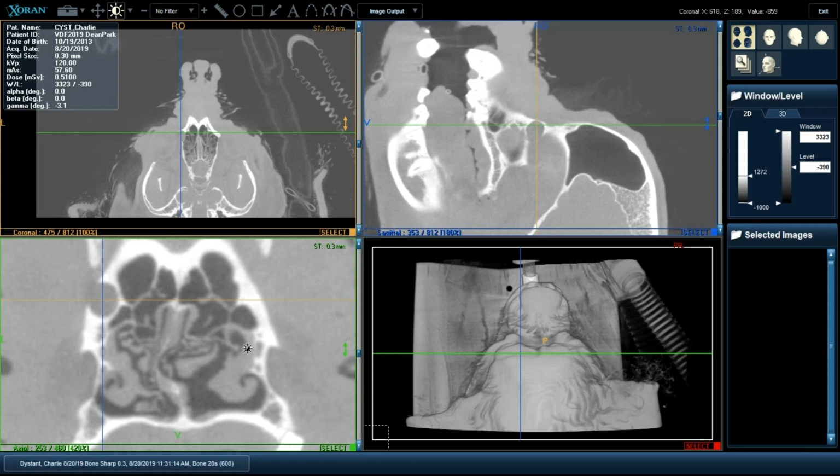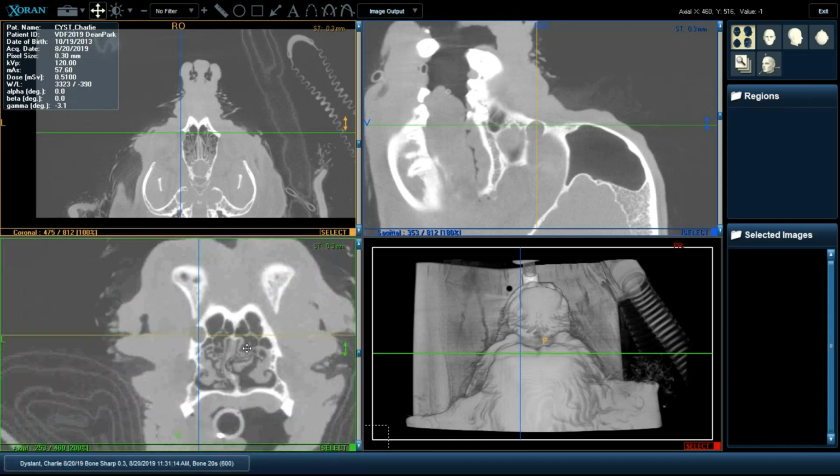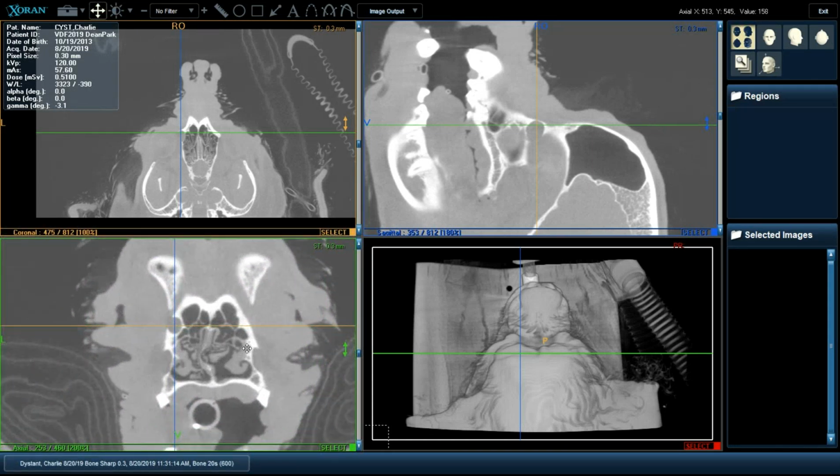Okay, I think we've covered quite a bit. We quickly saw how to at least initially go through a case and realize that with a little bit of habit, within a few minutes, we should be able to analyze and pick up some obvious pathology. We can then trace the panoramic plane, which is another way to look at disease, and look at details of pathology by doing cuts.